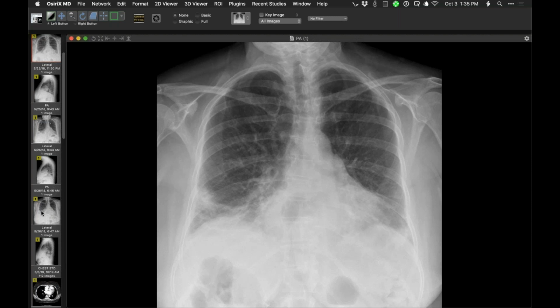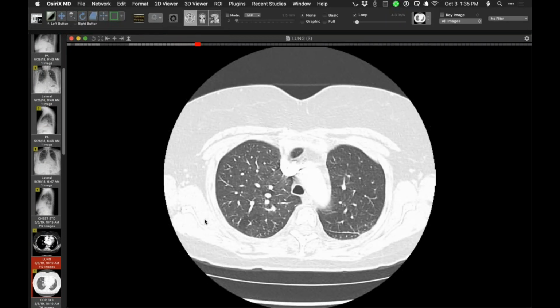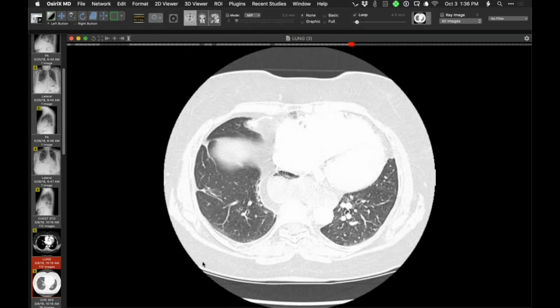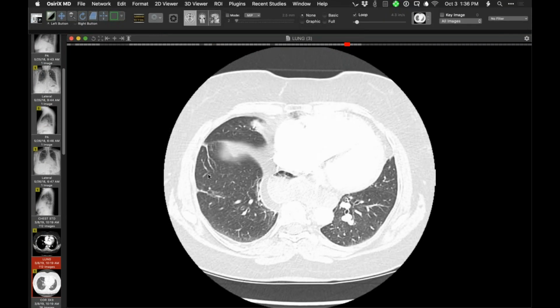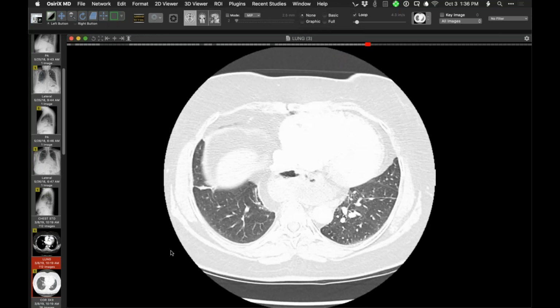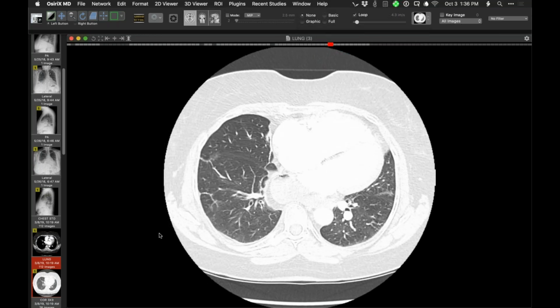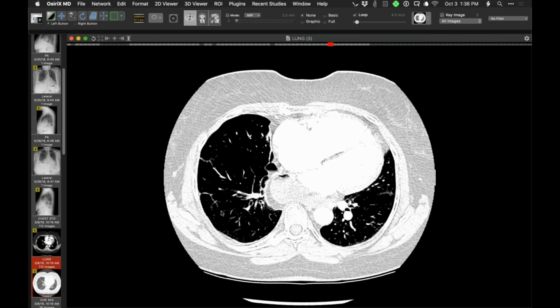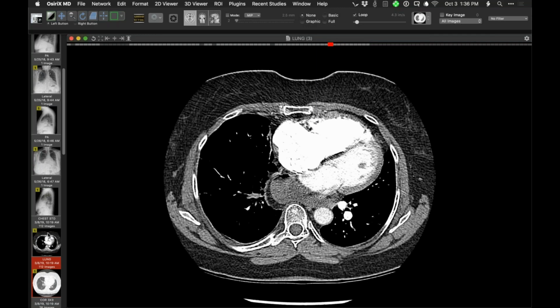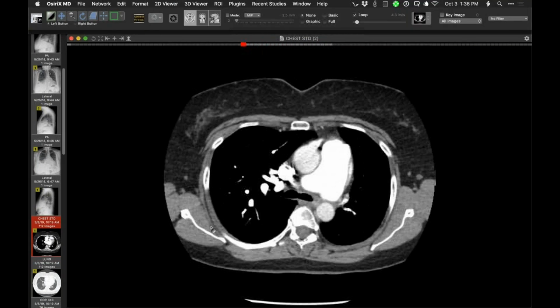And this is also then. Okay, so let's go forward to March. And certainly the basal lung opacities have resolved. One can reasonably speculate that these might be scars from episodes of pulmonary embolism, or an episode, and represent small infarcts. There's the hernia. And then I'll show you we have super typical findings of CTEPH. Let me actually bring in this one, which is less noisy.